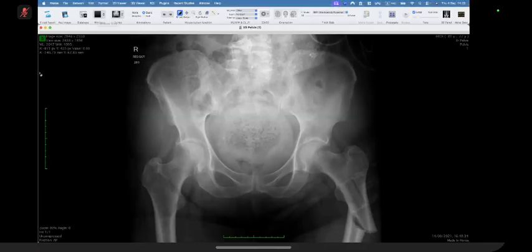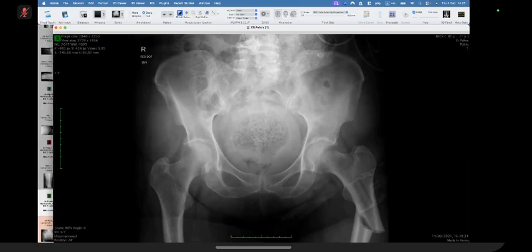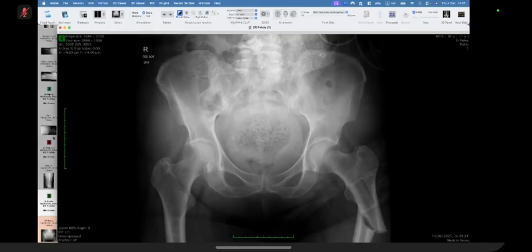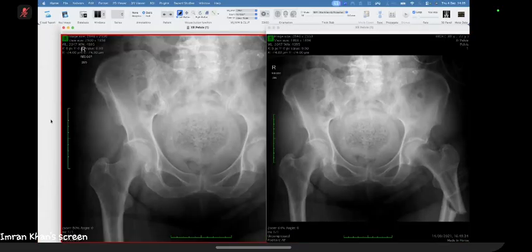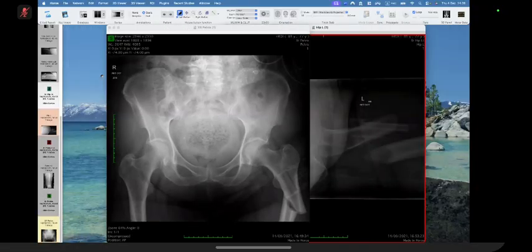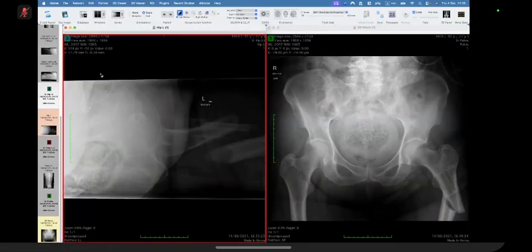Okay, all right. Hold on. Let me bring up all the images. Okay, so there's one here, and there is one there. Okay, tell me what you think.